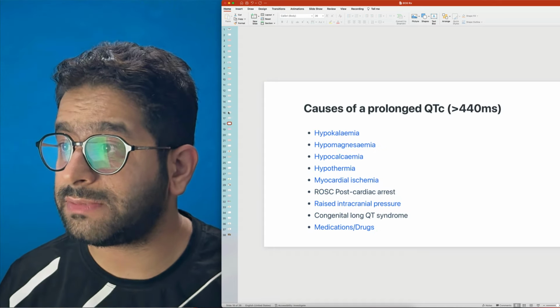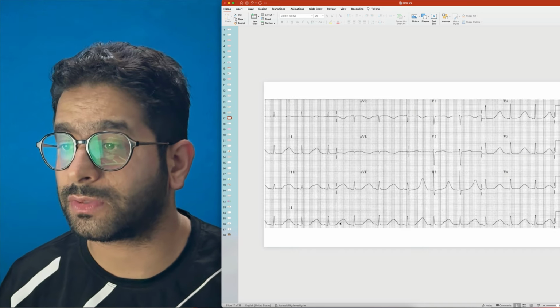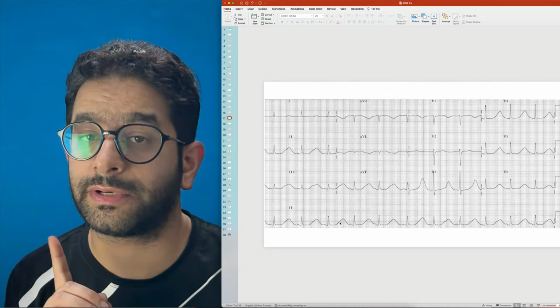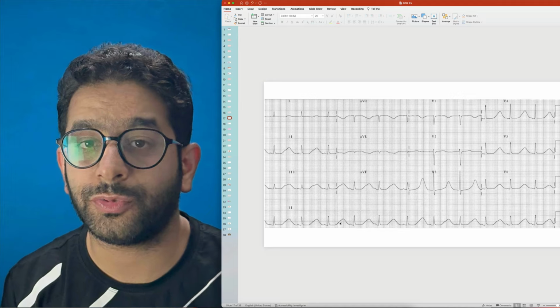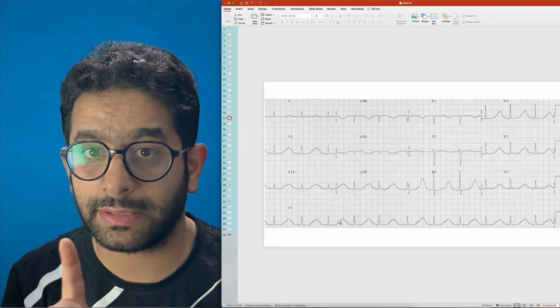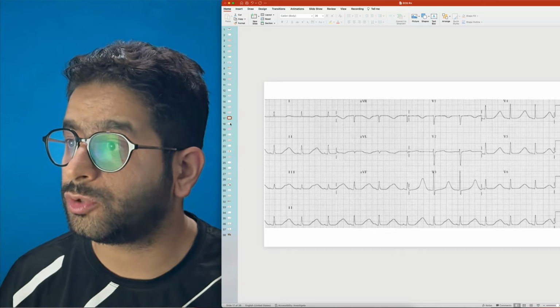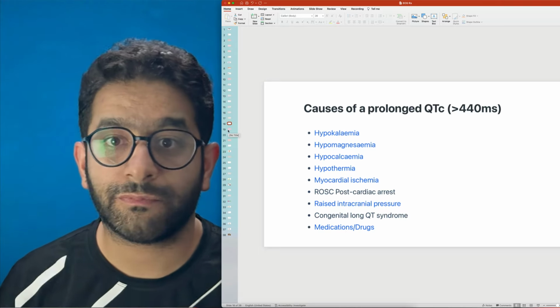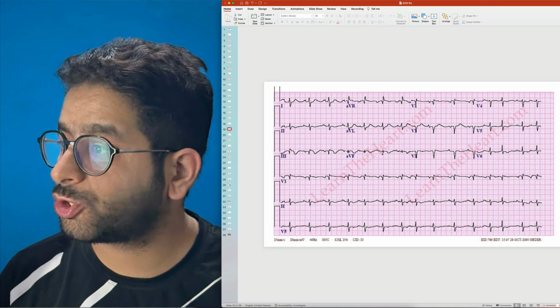Remember, this ECG may look benign, the heart rate is okay and everything seems okay except this QT interval is prolonged, but remember this predisposes to dangerous polymorphic ventricular arrhythmia. Polymorphic VT in the state of prolonged QT, that's what's called torsades de pointes, a lethal arrhythmia. An MCQ on that, drug of choice, magnesium sulfate. You may have to pace these patients with a temporary pacemaker to increase their heart rate. With increase in heart rate, the QT interval shortens. Next, I showed you this ECG.